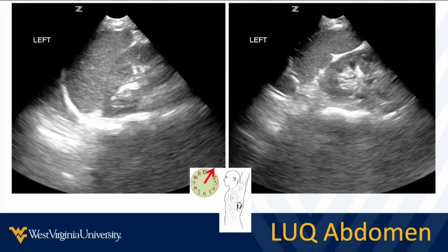You can get clues about splenic injury or not. Again, you're not going to rule it in or out, but recognizing abnormalities of the spleen. Remember, the spleen is the most commonly injured solid organ in blunt trauma. So if we know what the normal spleen looks like, we can pick up some of those injuries and find other subtle things. And we'll look at some examples of that.